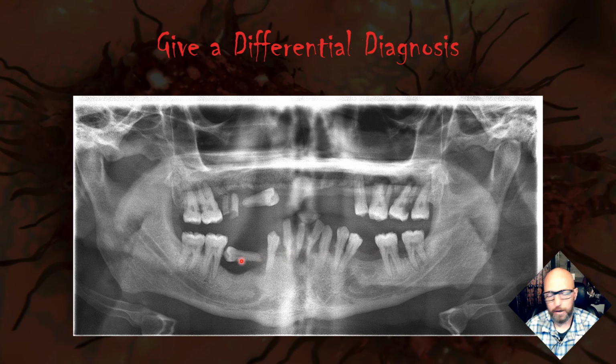The fact that we just see periodontal bone loss everywhere, you know there is periodontal bone loss going on. And yeah, in some of these cases, it's just a perio-endo lesion. Because the periodontal bone loss is so severe, we see large amounts of calculus around the teeth. Here's a tooth floating in air, completely come loose. Here, I wish I could get paid to extract these ones. Just go in and pluck them out. And so this is just a chronic periodontitis, just a very severe periodontitis that's completely destroyed the bone around these teeth.